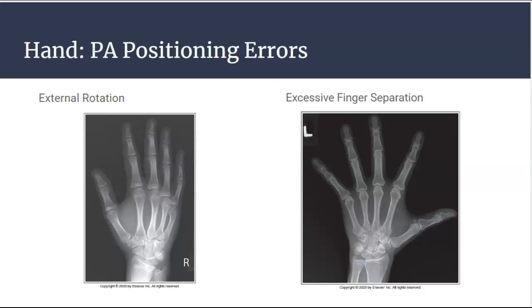If you bring the fingers together, you'll be able to collimate more closely and bring out that detail in the image and reduce patient dose.